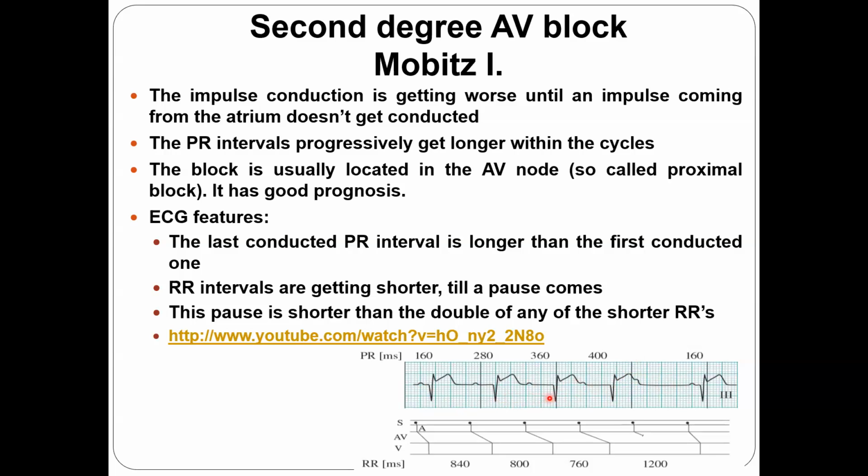but it's very important when we're talking about the AV block, because we do have the P wave only in AV block. Now, if you had to diagnose, for example, the Mobitz type 1 AV block based only on the RR, where you have only the QRS complex, you have to evaluate how the RR is changing. Importantly, the distance between the last conducted and the first conducted R is less than twice the last RR interval. This you should keep in your mind.